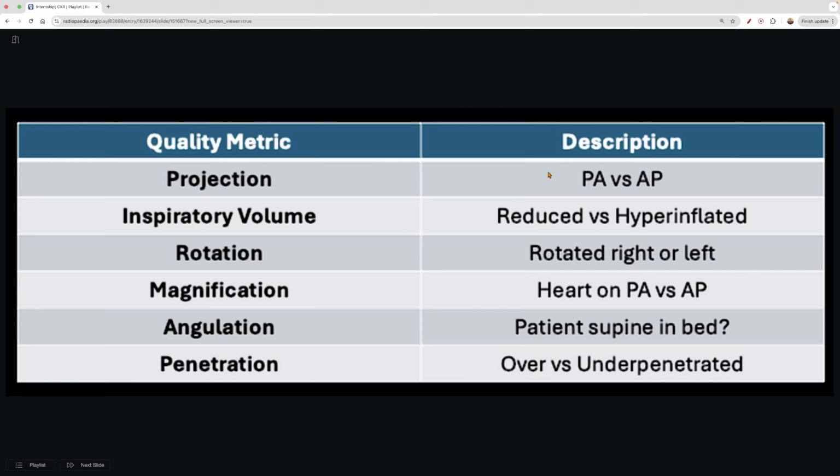So if it's from a posterior to anterior view, it would be the x-rays coming from the patient's back to the front. For a PA view, the patient is standing upright with their arms kind of flared out, and their chest is towards the detector. And then the light is shooting behind them. And alternatively, AP is the light is shooting in front of them where their chest is towards the projector and their back is towards the detector. And that's important to note, and we'll show why in a second.